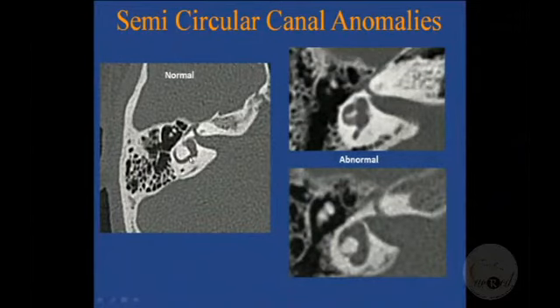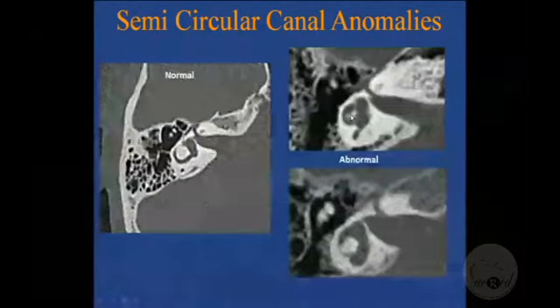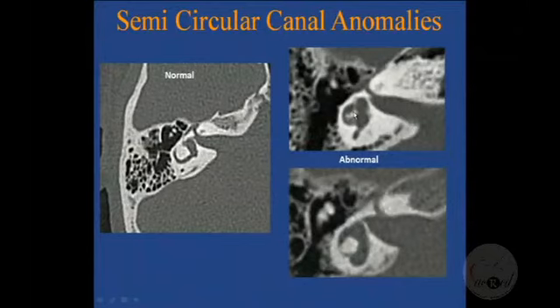Or it could be drifted to the side. That's a bone island that looks as though it's well formed, but the semicircular canal is thinned out, so it is drifted off to one side. That's an anomalous lateral semicircular canal.